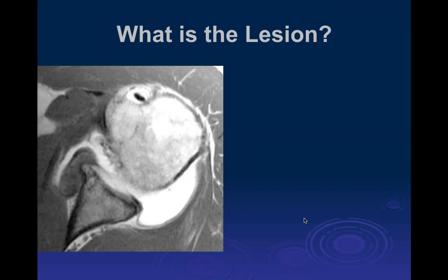Okay, let's see. Jonah, what do you think of this? Sure. So, what is the lesion? We've got an axial view of a shoulder, which appears to be performed as an arthrogram. Now, we've got this oval, loculated, intermediate, low-intensity structure coming around the anterior labrum, as you're outlining there.